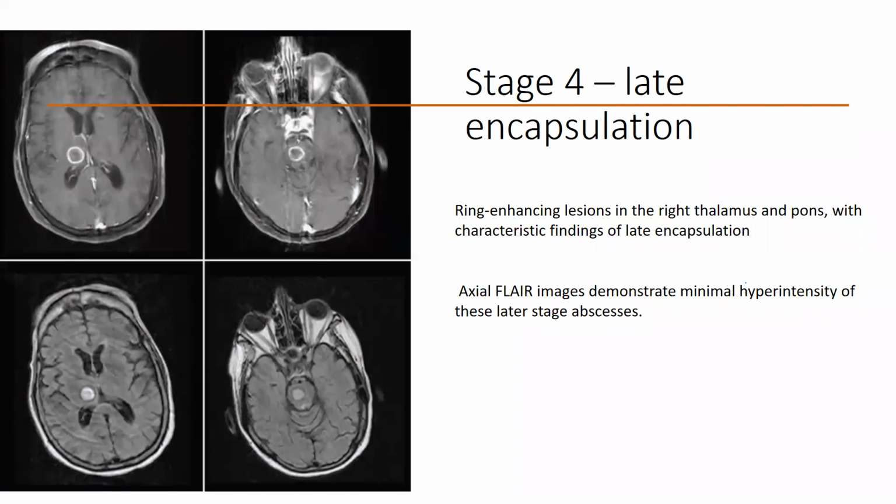Okay. And how to differentiate starry sky NCC versus miliary TB? See, NCC will be cystic, and miliary TB will be like rice grain nodular type of lesions which are very much scattered. Calcification will be more common. In the CT that you show, in miliary TB the calcification will be less common compared to a patient with NCC where there is a starry sky appearance.